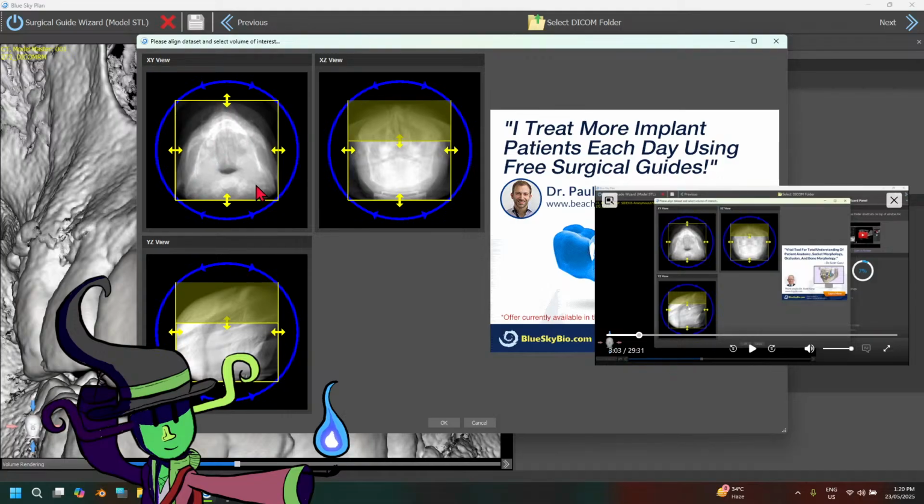So yeah, I can sort of see the dental arch here. Other than that, I can't make out anything else. Really nothing going on up in the skull. Oh wait, actually, I can sort of make out the teeth here. Yeah, it's like this one, right?